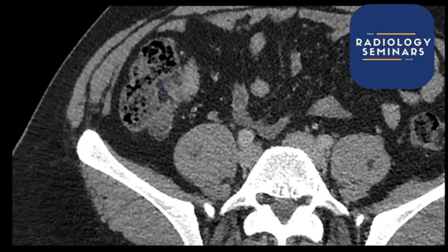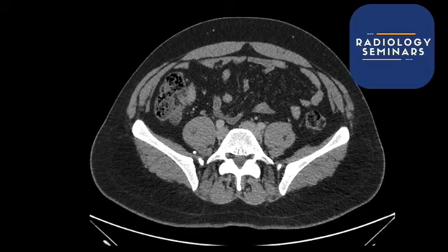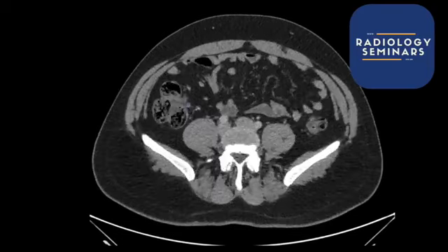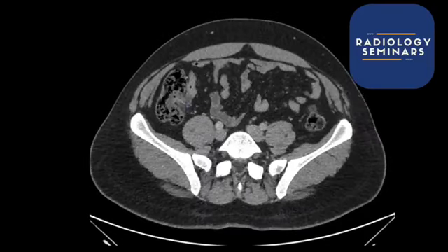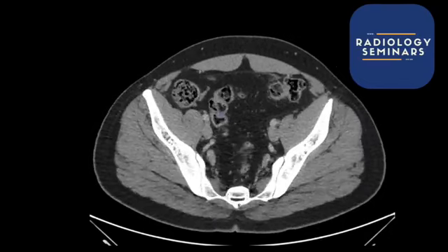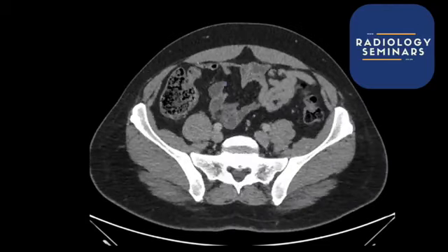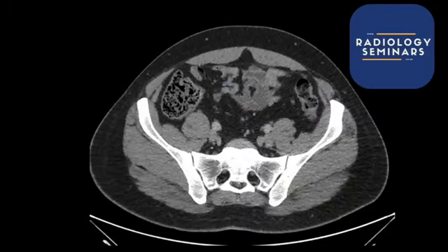So a good way to identify where you are on the scan and in the bowel. So you're at the ileocecal valve. So anything coming out of that area is going to be your terminal ileum, going all the way like that. Generally speaking, I don't really follow the small bowel all the way, because it is quite convoluted. It's a really, really long way, especially if everything looks normal.